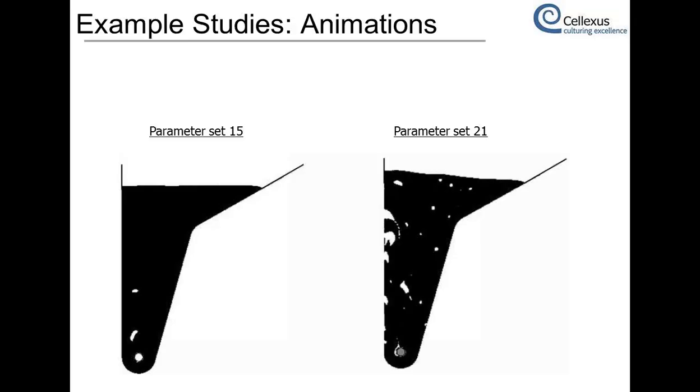So we knew how to move the equivalent circular diameter to a lower value or increase it in the opposite direction. Also, if we changed the port angle, we could reduce the equivalent circular diameters, and also change the aspect ratios. And obviously if we changed the number of ports, we didn't find much of an effect there, which was quite surprising.